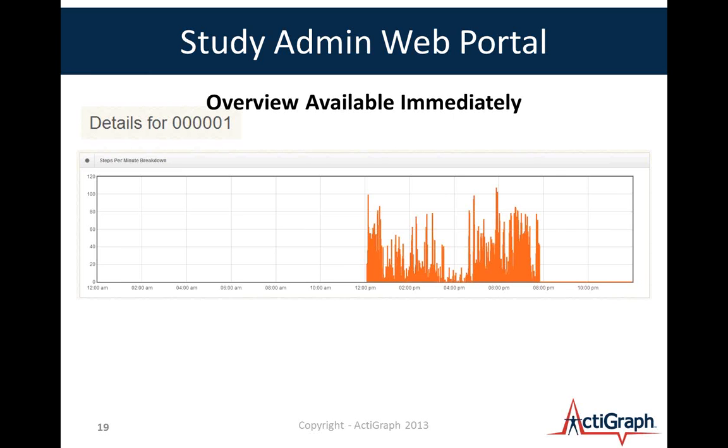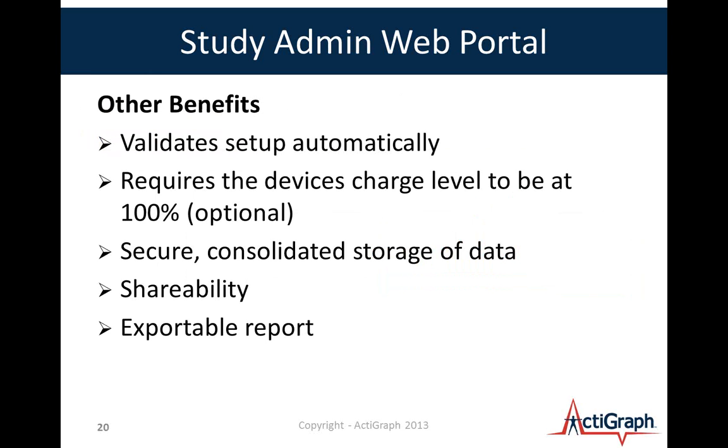Some other benefits of the system: we've already talked about the fact that it validates your setup automatically. So if you work with us and decide that you want a specific measure, and you know what the format of that measure should be, then you can provide some strict instructions on that formatting and ensure that all of your data formats match, regardless of who's entering that data.